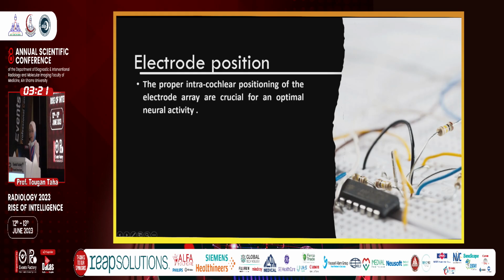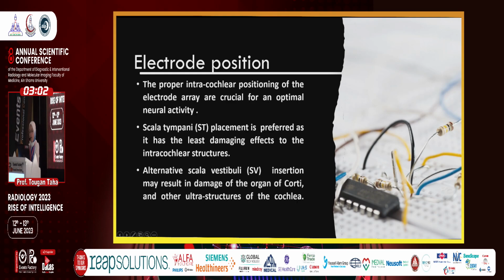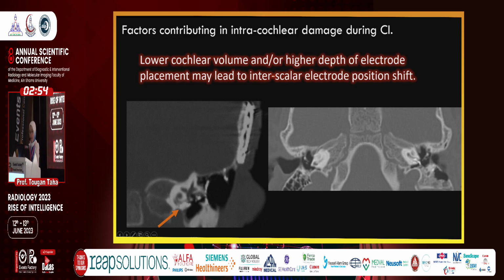The proper intracochlear position of the electrode array is crucial for optimal neural activity. Scala tympani placement is preferred as it has the least damaging effect to the intracochlear structures. Alternative scala vestibuli insertion may result in damage of the organ of Corti and other ultrastructures of the cochlea.